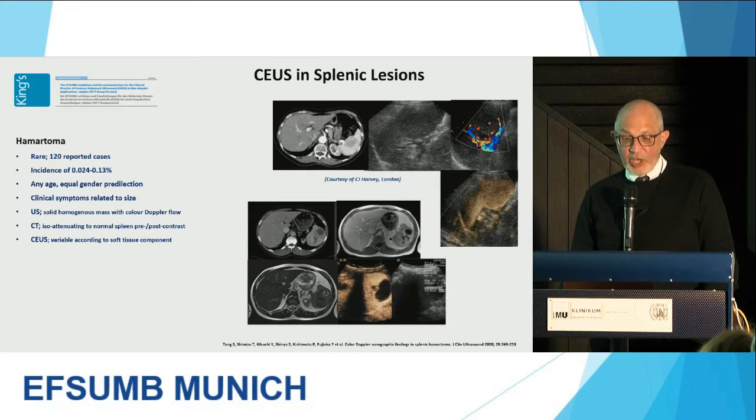Hamartoma, rare, only 120 reported cases worldwide, and these are images provided by Chris Harvey from London to show this hamartoma with vascularization on your color Doppler flow, and the appearances on the MR and the CT. Again, it's a difficult diagnosis to make, and contrast-enhanced ultrasound is actually variable depending on what the hamartoma is made of, and pockets of reflectivity, etc.